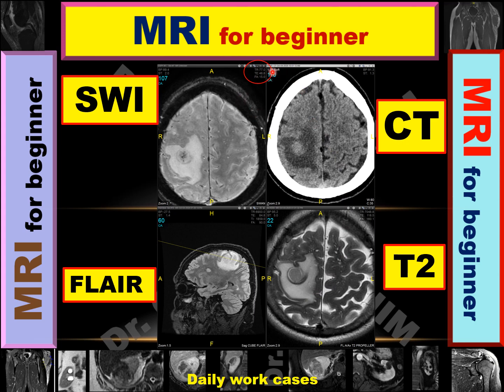Also, if there are any confusions, look for the parameters, TR, TE, and the flip angle, or the name of the sequence as we see here at the bottom of the image. As you see, these lesions appeared bright in the CT, representing hemorrhage, which is confirmed by the susceptibility weighted image as dark signal within white background.